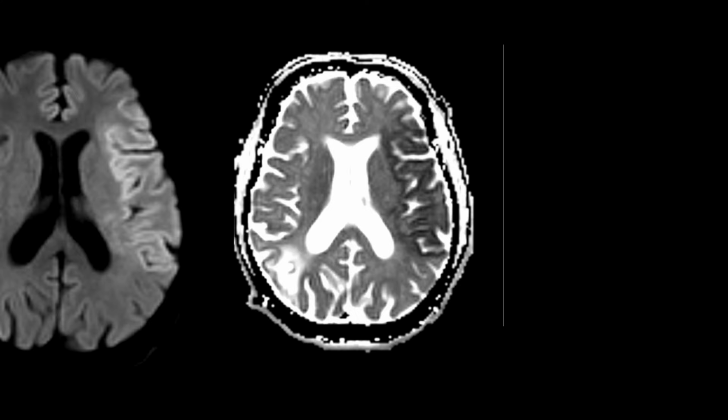In this case, we have restriction of diffusion in this region, which is supplied by the left middle cerebral artery. So this is a left MCA territory infarct.